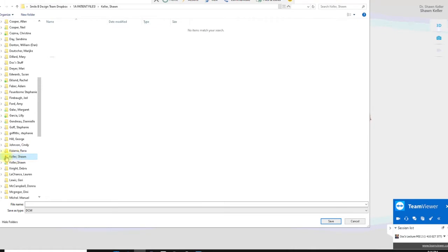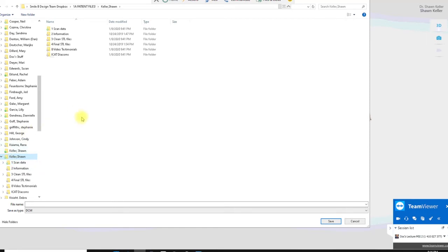There's one. It looks like I have a couple. This is what we call dirty data, or just regular scan data. It's not clean yet. Clean data means it's been trimmed and aligned already. This is just plain old scan data. It hasn't been trimmed, it hasn't been aligned. It's who knows where in space. Kind of not very useful right now.